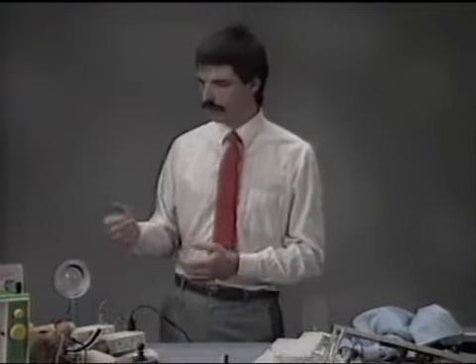Typically, you've seen people with language boards, and they can point to words and phrases and communicate in a very slow method, but communicate needs and feelings by using this board. Unfortunately, that system requires somebody be there who can actually read the board or understand the pictures. It's tough to talk to a sibling who's maybe 2 or 3 years old if they can't read the board as the individual points to the pictures. But they can understand speech, and more communication aids based on computers have looked at speech output.